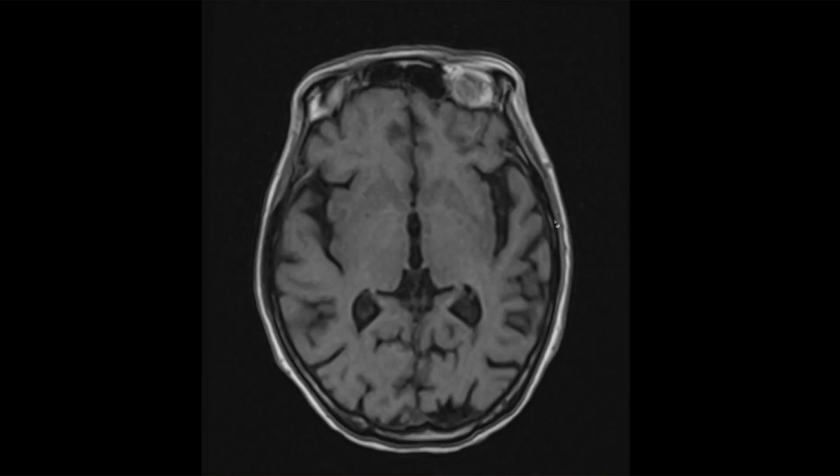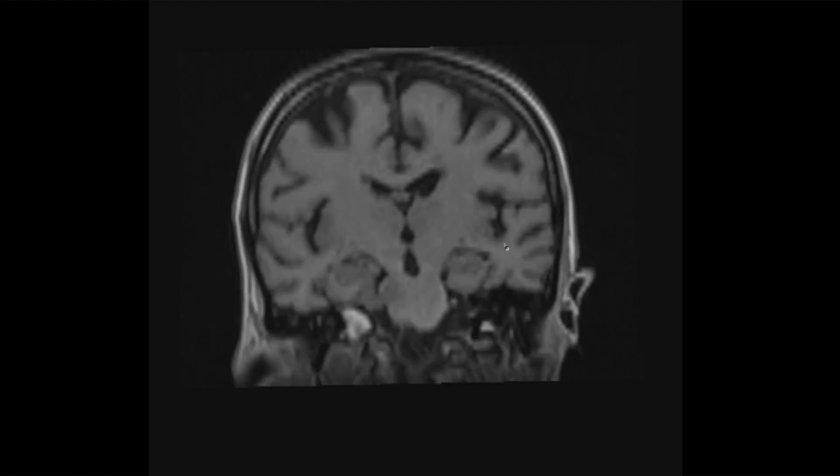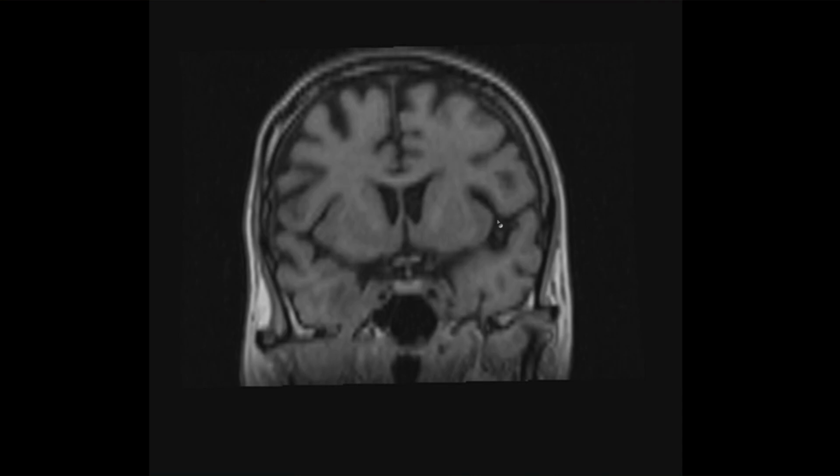So, I guess you could look at the temporal lobe, see if there's a lot of atrophy. Particularly these coronal images, I think are really nice. Look at the temporal lobes. You just see them right here. For mesial temporal lobe sclerosis, you could see focal cortical dysplasias, maybe you would see ectopic gray matter in epilepsy sometimes.